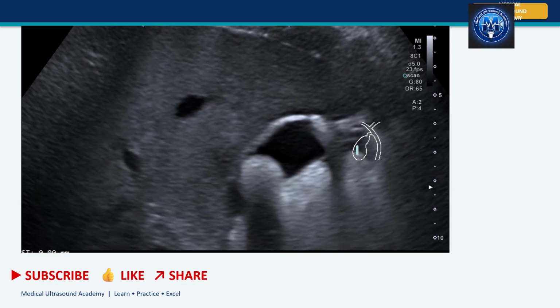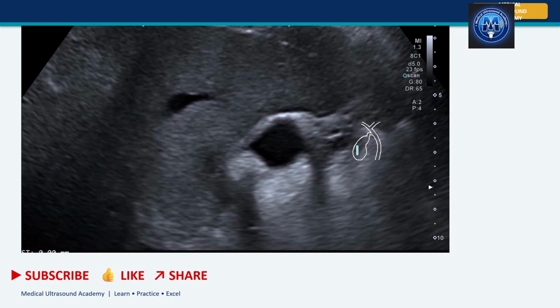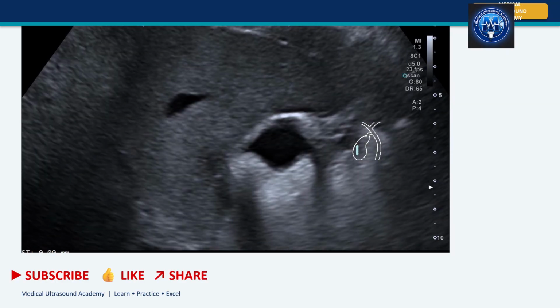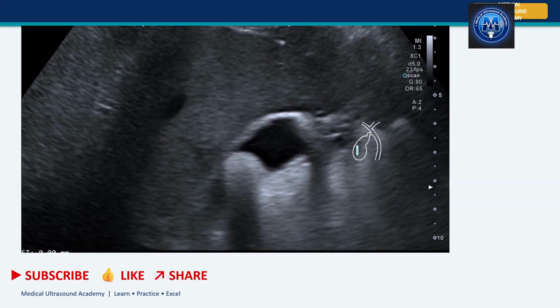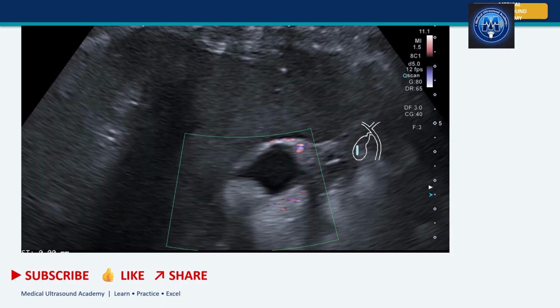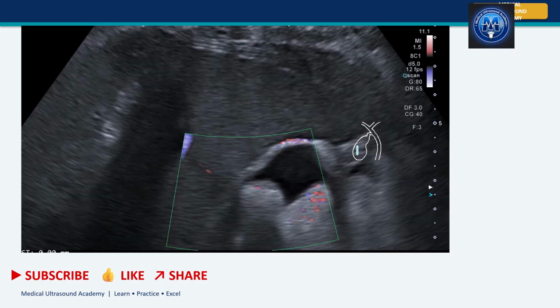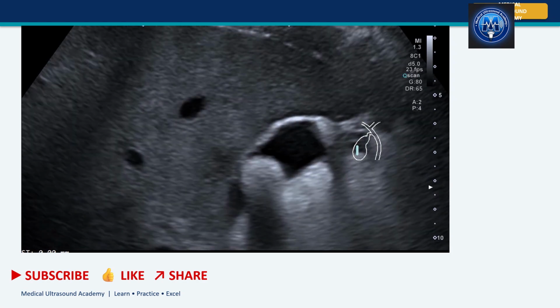Regarding acute cholecystitis, gallstones alone do not automatically mean that the patient has acute cholecystitis. In suspected cases, evaluate for a combination of findings such as gallstones plus gallbladder wall thickening, gallbladder distension, pericholecystic inflammatory change or fluid, and a positive sonographic Murphy sign. No single ultrasound finding should be interpreted independently of the patient's clinical presentation.